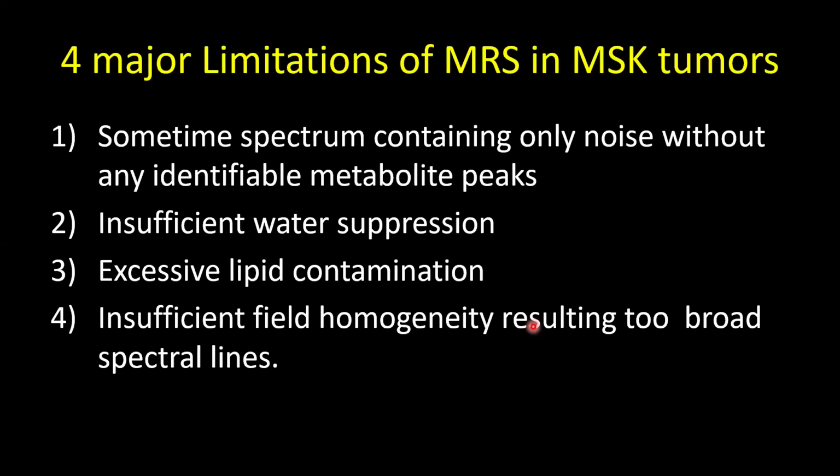And second important point, if you do MR spectroscopy, we have to use proper water suppression. If you don't use proper technique of water suppression, you get a huge water peak. It suppresses all the metabolite peaks. And excessive lipid contamination: we always assume that lipid and lactate always come into the spectroscopy in MSK tumors.